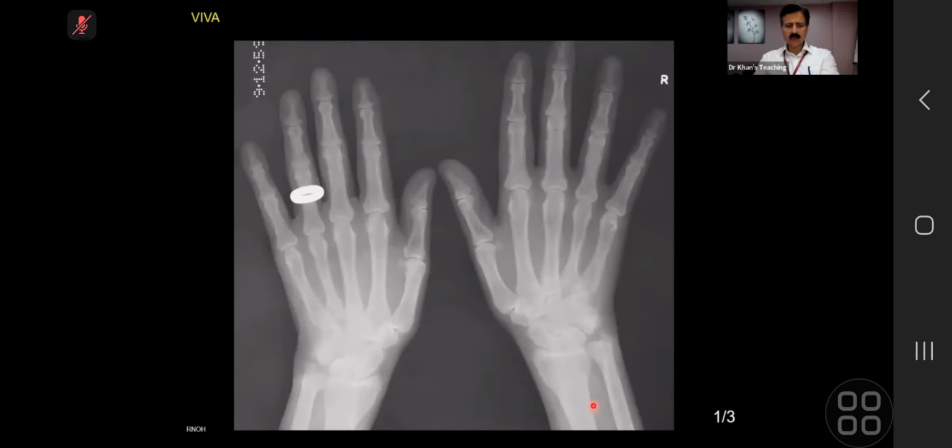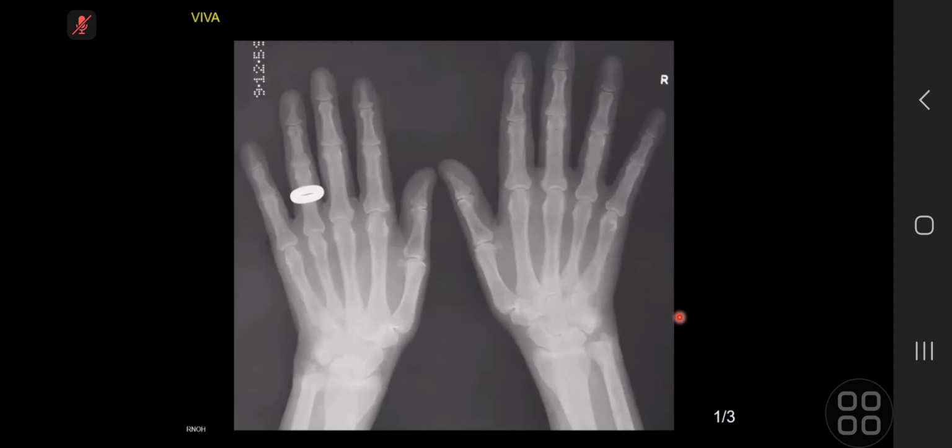Now, okay, another case for you, candidate 1. Okay, this is a radiograph of both hands in a skeletally mature patient. The bone density appears to be preserved. There is acroosteolysis of the terminal tufts bilaterally in the second and third digit on the right and on the third and fourth digit on the left.